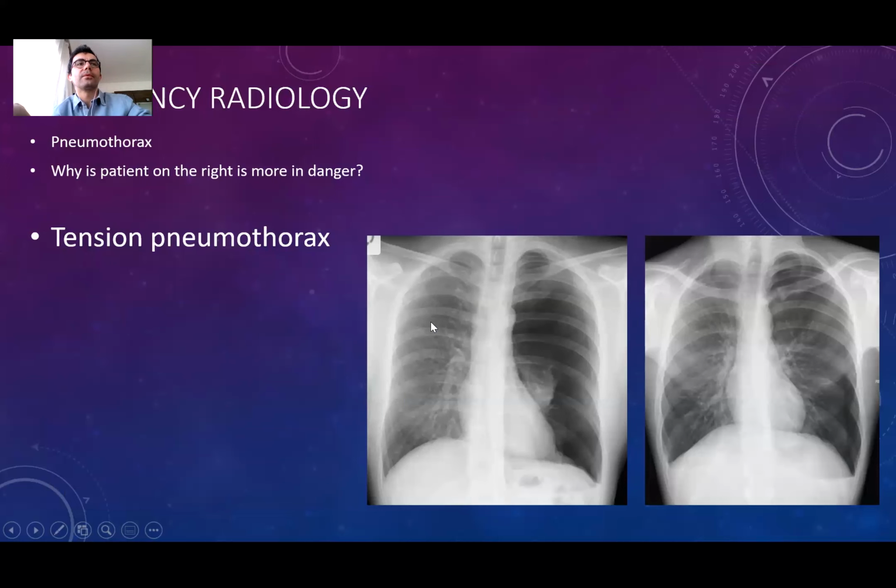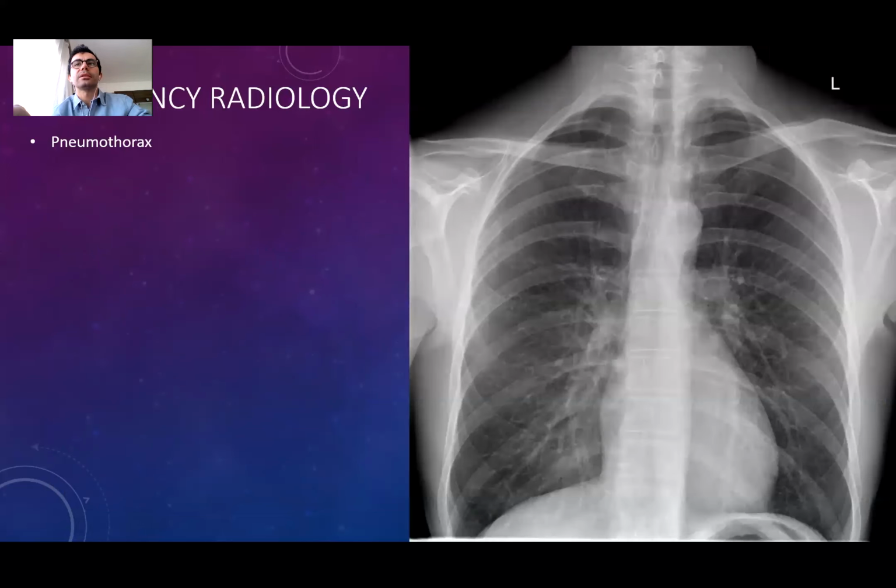Okay. This was a case of tension pneumothorax. This was another case of pneumothorax. In your oral examination, there will be a lot of pneumothorax cases, believe me.